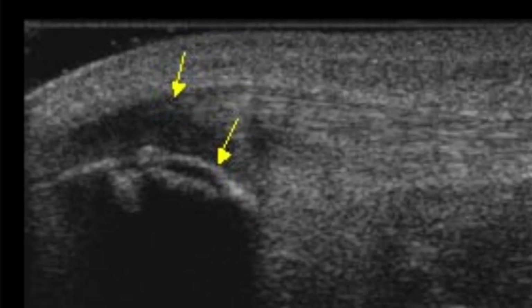In this image you can also appreciate all these findings. Look at the patellar tendon where it inserts at the inferior pole of the patella. There is a change in the echogenicity. Besides this, small fragmented particles can be seen. So this is what Sinding Larsen Johnson's looks like on the ultrasound image. So plain radiograph, MR and ultrasound are useful for this.